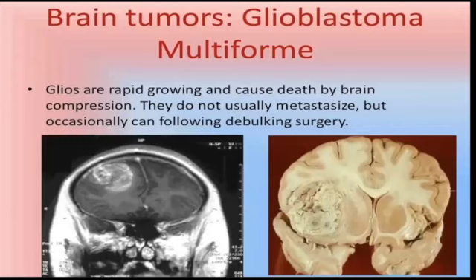But the most important thing that you should look for is that it's not homogeneous, meaning there are a lot of different colors within it, it has irregular borders, and there's a midline shift. These are the main points that you should look for if you're looking at a glioblastoma multiforme. And if you are looking at the case or the history, you're looking at a patient who's probably in their mid-60s.